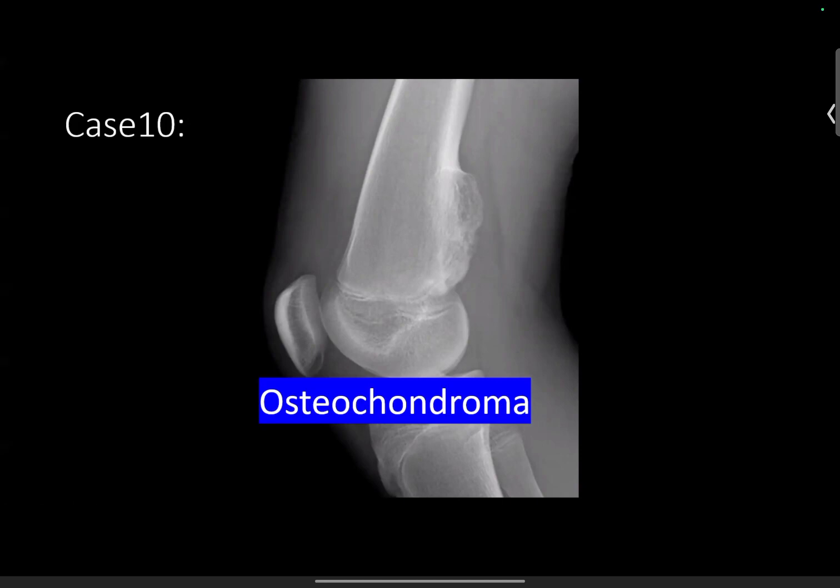BPOP, someone put BPOP, bizarre osteochondromatous proliferation, or Nora's lesion. That's usually in the hands and feet, and it's just like a little osteochondromatous lesion, not really like this big. That's not a bad thought as well, though.